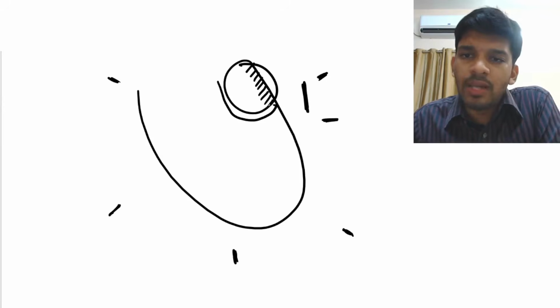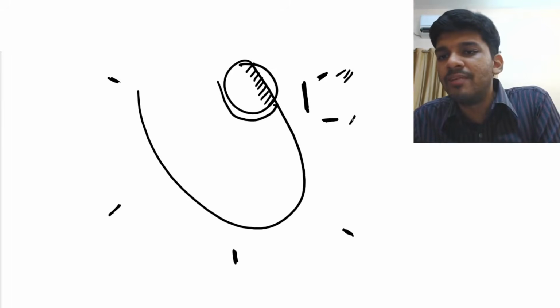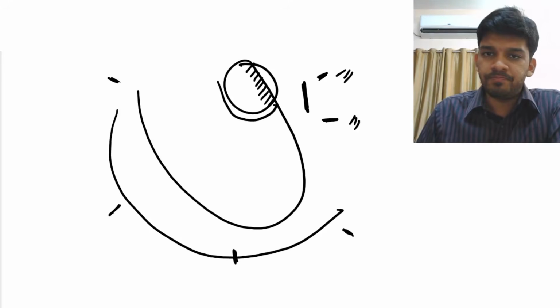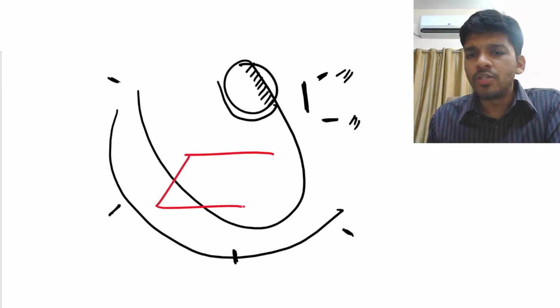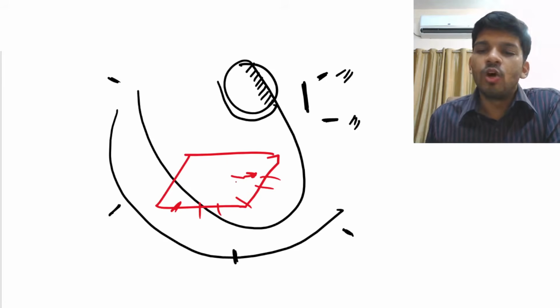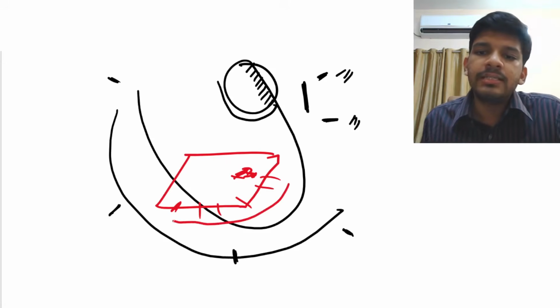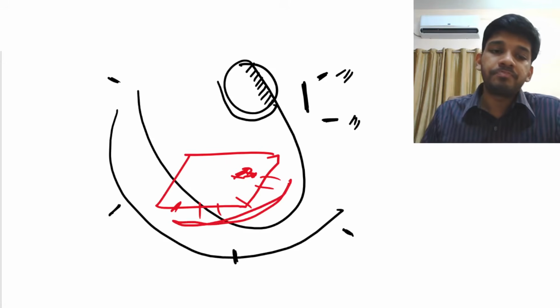And that also is a small area. So you might not get very prominent ST elevations in this, and these leads will also not be very sensitive to these changes. If you look at it in the horizontal plane, in that case also see V1, V2, V3, V4, V5, V6. It is almost coming at the level of V6 or even somewhat more posteriorly. So these precordial leads are also not able to register this MI.